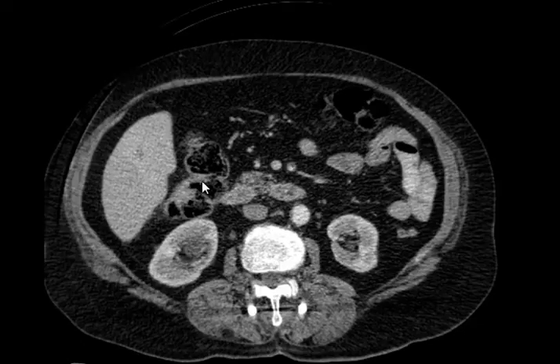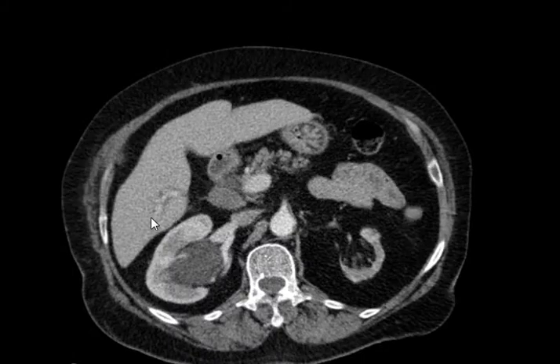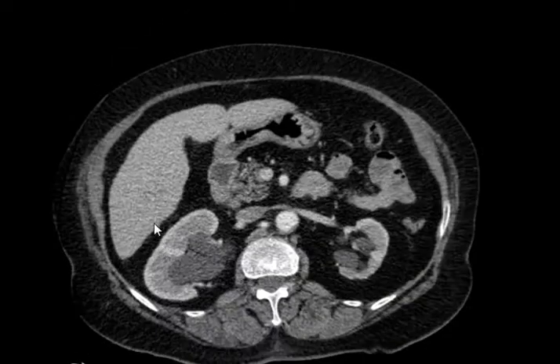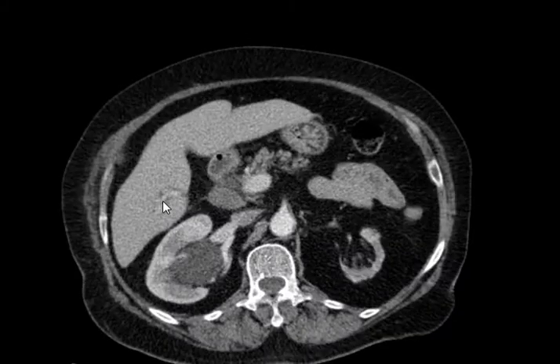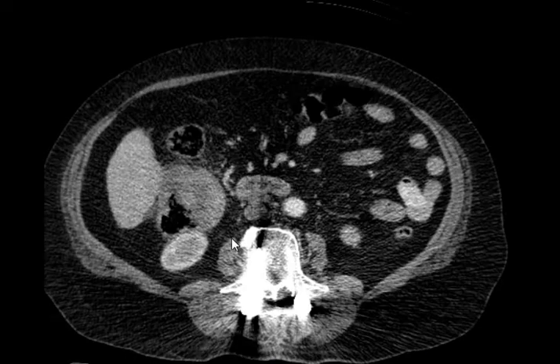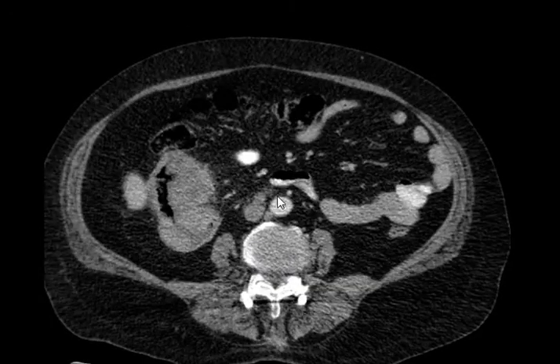Metastasis to the liver? We see the lesion in the liver also in segment 6. Where is the lesion? This is just portal. We agreed there is a cyst in the liver, a simple cyst, which is not relevant. What is the primary pathology? Colon mass. Which is what? Adenocarcinoma, most likely carcinoma.